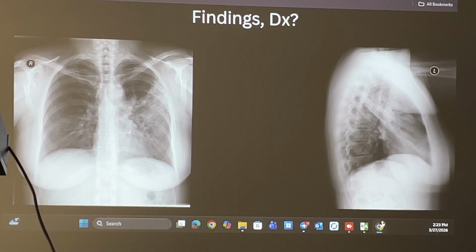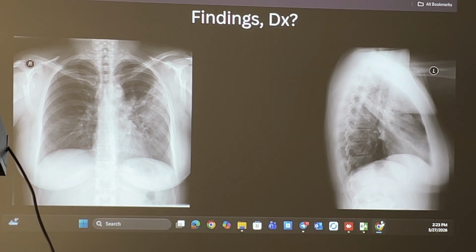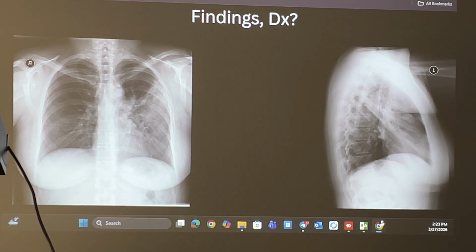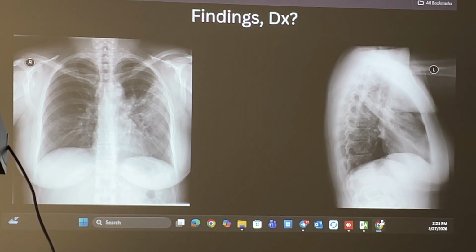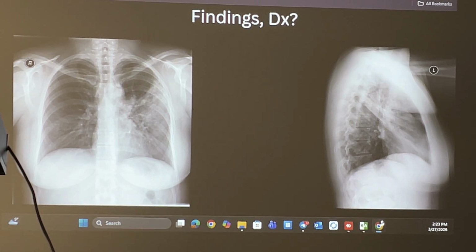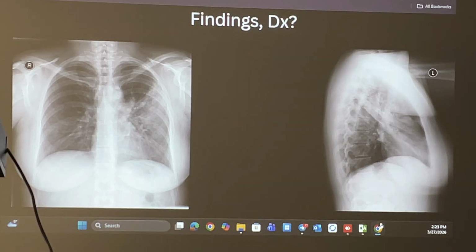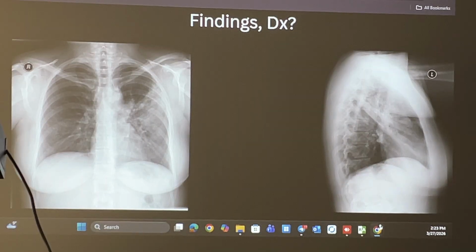How else can we differentiate whether it is upper or lower lobe? Similar sign with the diaphragm, by fissure. You cannot see the fissure here. You can tell that there is no silhouette sign with the hemidiaphragm. Where do you see the silhouette sign? With which structure? With the heart. The left heart border is silhouetted by the consolidation, and it is upper lobe. And when the hemidiaphragm is, it is the lower lobe.